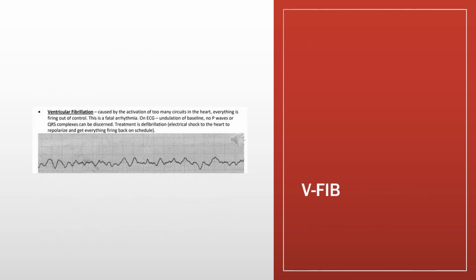So ventricular fibrillation, or VFib, is another one of the fatal arrhythmias that is shockable and is discussed in your CPR. So VFib and pulseless VTach are two of the shockable rhythms that require defibrillation in order to convert this back to a normal sinus rhythm.